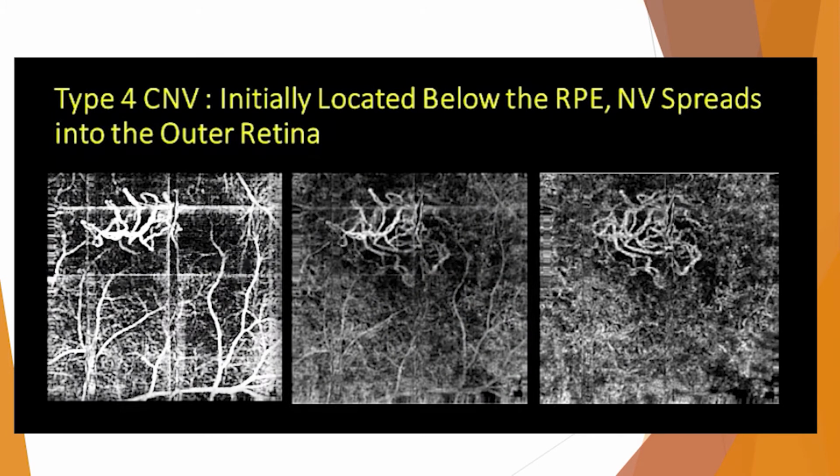That very vague one went away. Remember that the occult is not going to affect outer retina, so that means that just my classic is showing on the last slab. Okay, so that's a really nice way of kind of moving through the pieces and looking at the CNV.